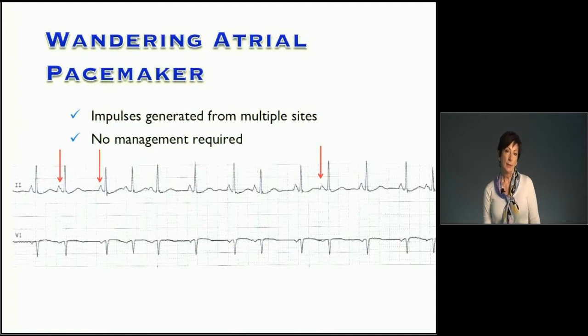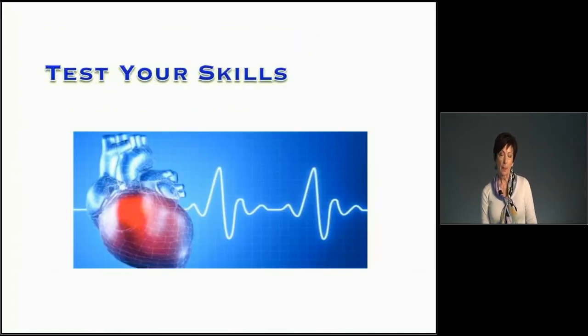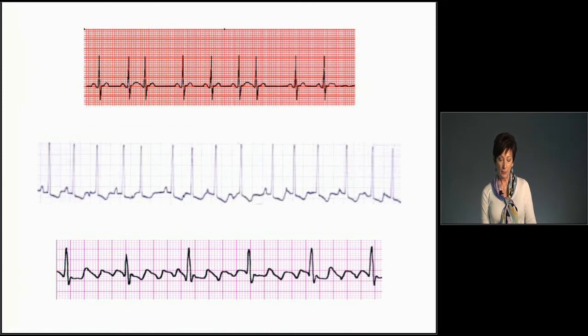Well, now it's time to test your skills. So this would be an opportunity for you to interpret the rhythm strips that are on the slides or in your handouts, and then I will give you the answer. So here are the first three, and we'll go over these.